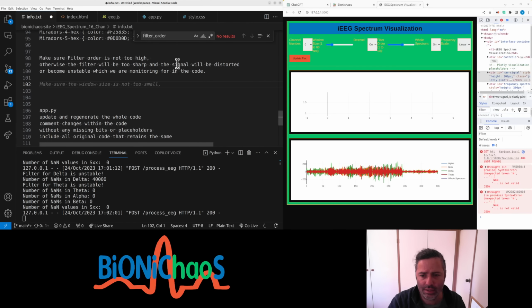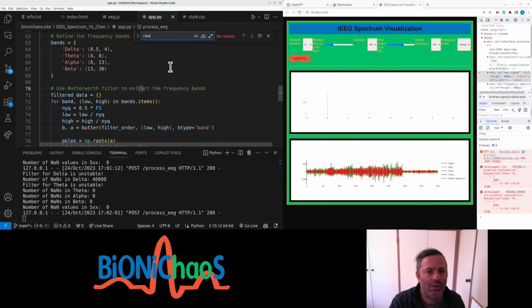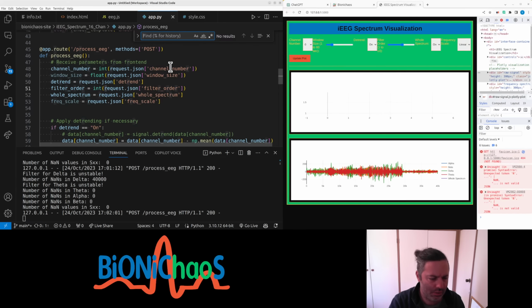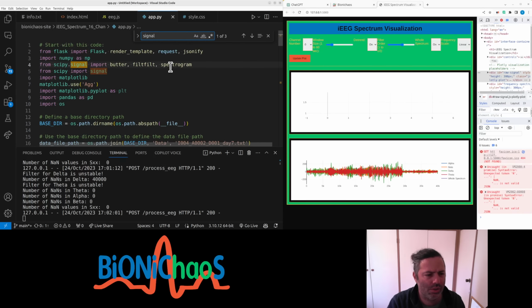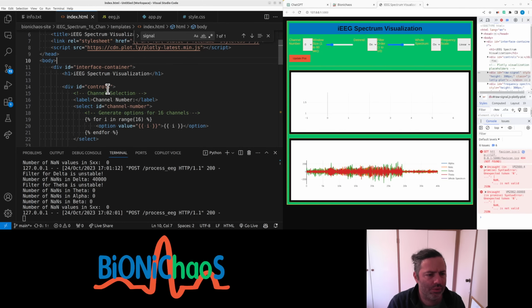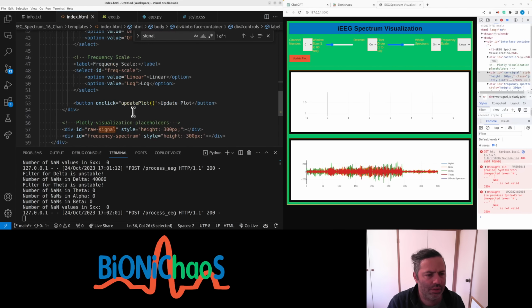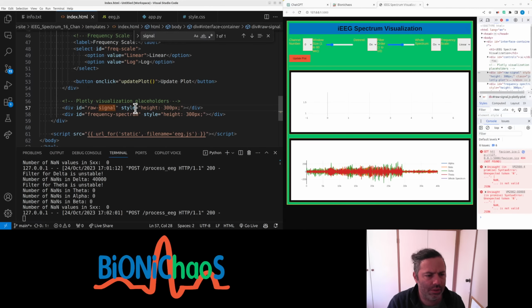Okay, the other thing is what's called raw. It's meant to be the original. Channel number, the trend, whole spectrum, frequency scale, filter order, raw signal.